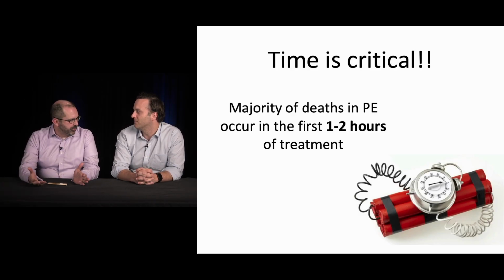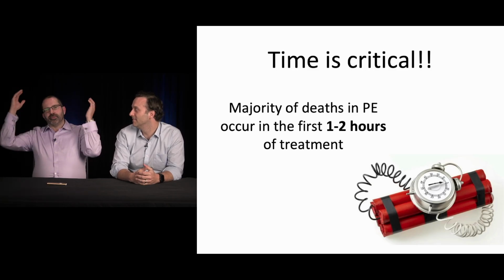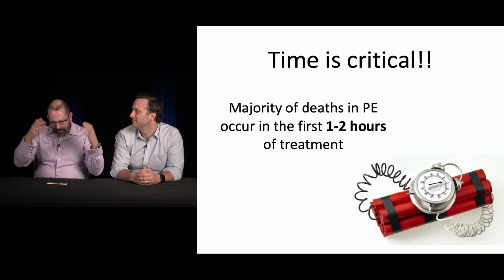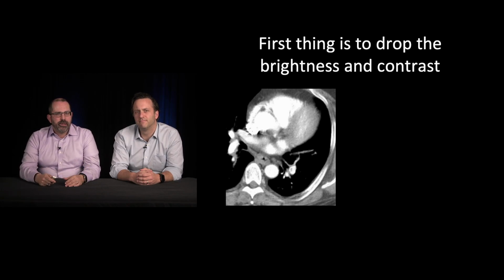And, you know, I teach this a lot, obviously. And the reaction I always get is hands throw up, and they're like, yeah, I just can't read these, you know, and it's just inevitable. I think it's because people just get overwhelmed. Yeah. And it's because you're trying to look at too much at once. And so I'm going to walk you through how I do it.